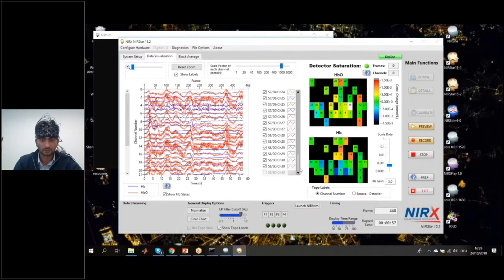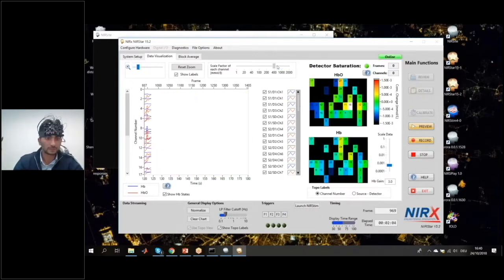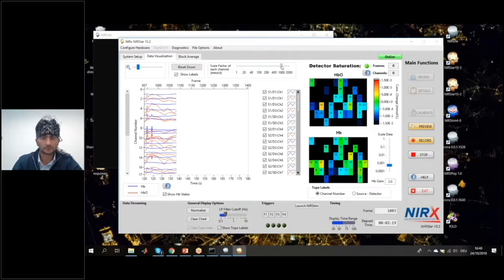Let's go to the last one. As you can see, channel 30 is my short channel from source 8. Details about the data shown here, the online data, were also discussed quite in detail by Thomas in the NIRStar 15.2 overview webinar. So if you would like to know more, please refer to that webinar.